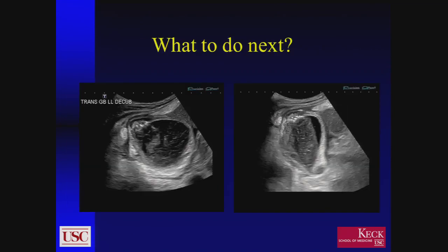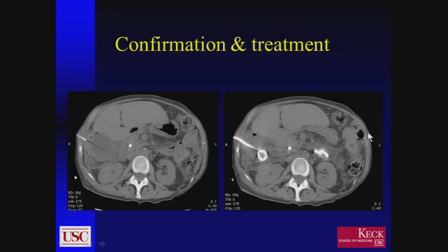So always be very careful when you're looking at the gallbladder wall, and again, when patients have either gangrenous cholecystitis or emphysematous cholecystitis, the pain may miraculously go away. The Murphy sign will typically be negative because these things then get denervated so they don't hurt anymore. So that can be a very controversial thing that can really fool you. But again, always look to see the wall. Make sure you don't have little echogenic foci within it. These are not shadowing real well, which you'd expect from the air. But then there's this little pocket over here extending out representing the perforation.